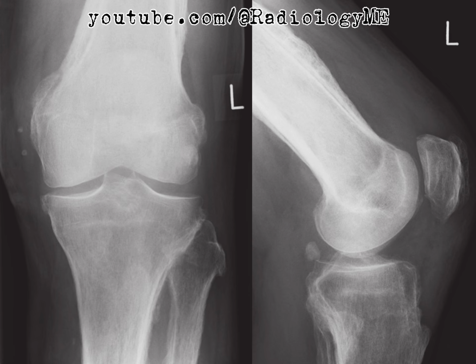At this stage, I would typically suggest correlating these radiographic findings with clinical history. Does the patient have a history of chronic cough, smoking, or other pulmonary symptoms? If so, this strengthens the suspicion of HOA secondary to an underlying lung pathology. The next logical step would be a chest radiograph to check for pulmonary disease or mass.